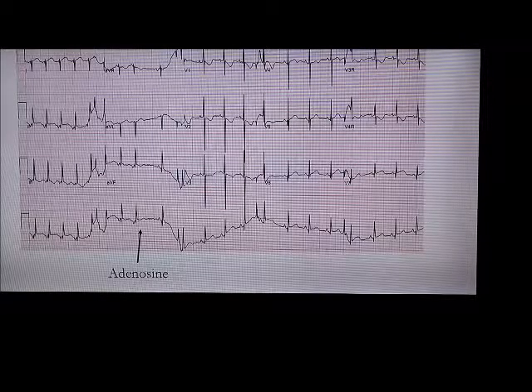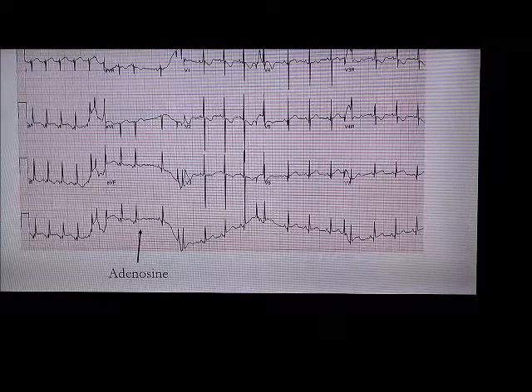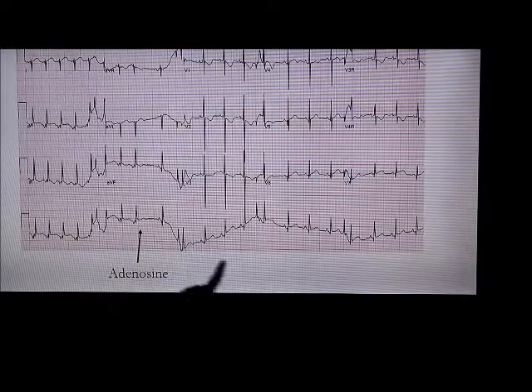You sure? It seemed to be converted to a normal rhythm. Now we need the P waves and then the QRS. Where's the multiple? The rhythm slowed down and then it came back again. Yeah, so the rate slowed down and it didn't come back again. Here it's still normal. The P waves become upright after they were negative, and it stays upright.